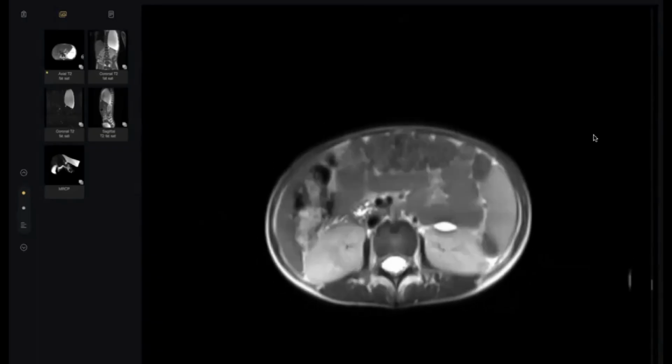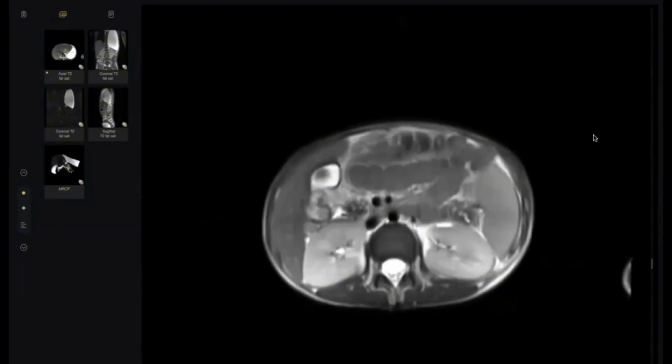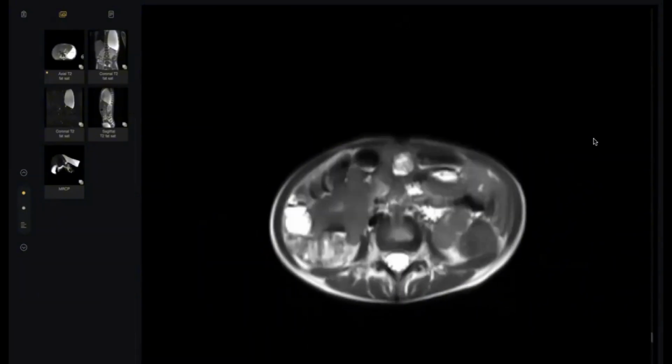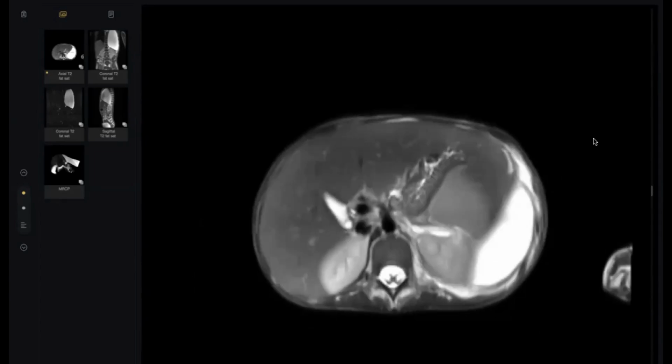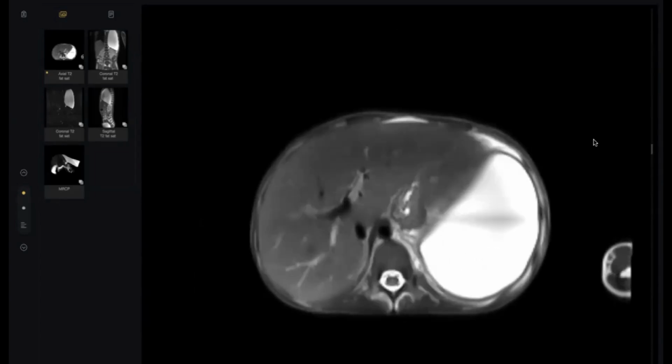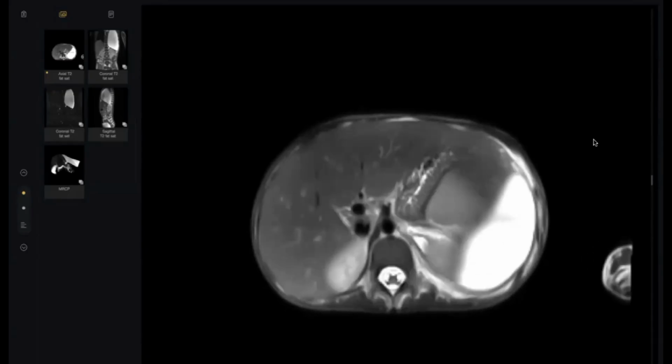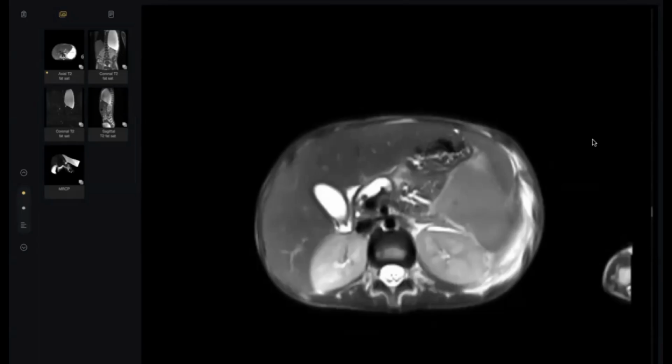The stomach appears to be compressed. In these images, the liver appears to be fine. There is no intrahepatic biliary duct dilatation. This effusion is recurrent despite multiple drainage. Any cardiac abnormality which may lead to it, or renal abnormality? No.